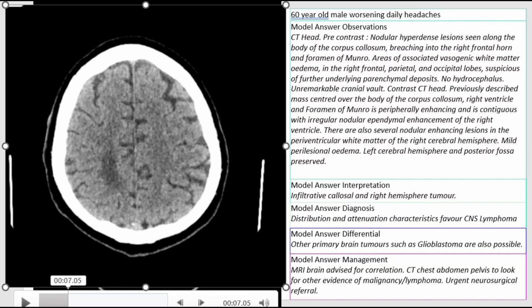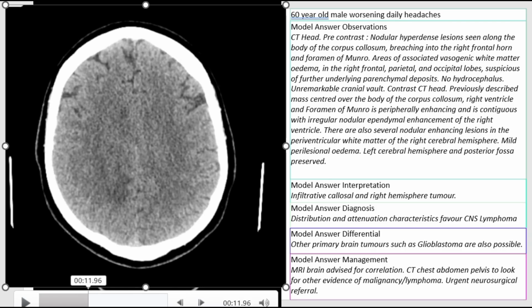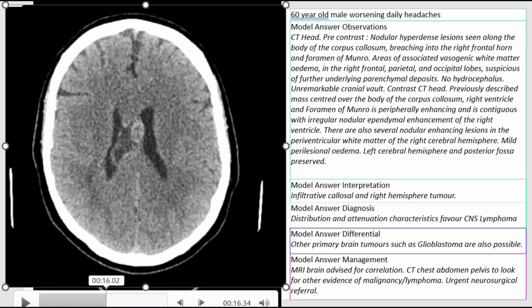So the first part of the lateral ventricle to be seen starting from the superior cuts of the brain is the body of the lateral ventricle. So these are the bodies of the lateral ventricle, and the connecting white matter fibers in between is the body of the corpus callosum.